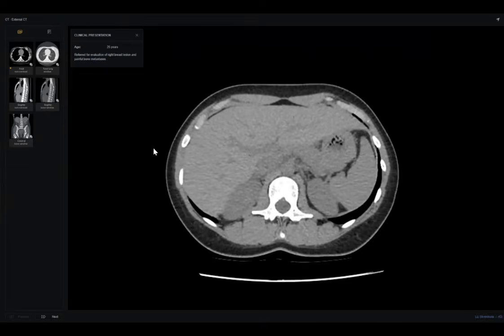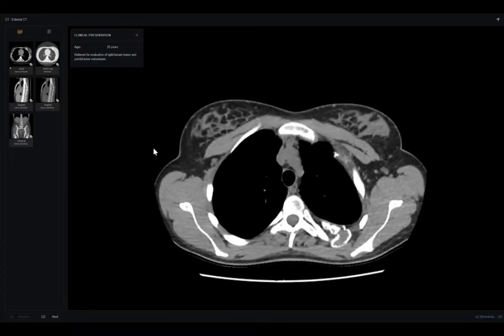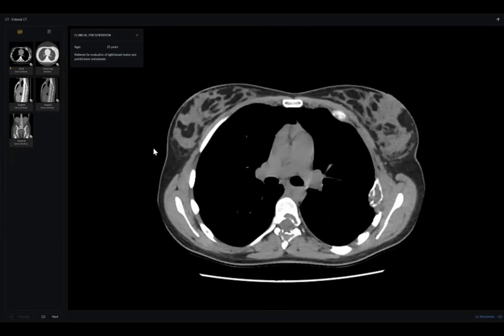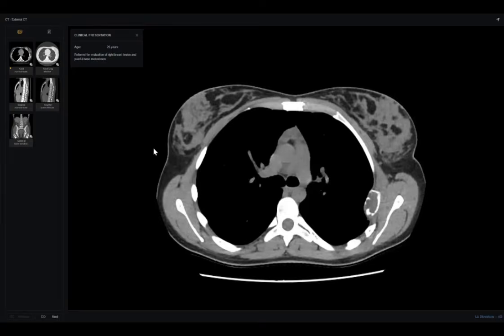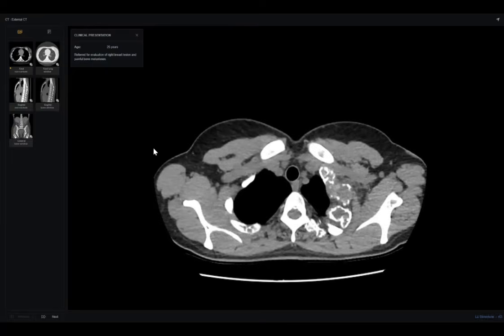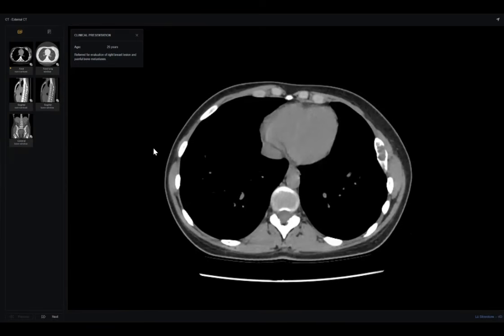Even here, if you look at the breast, there is nothing obvious, but this is the non-contrast. Overall, the breast looks normal, with no pathological lymph nodes in both axillae. Again and again, ask for old or primary examinations like X-ray, ask for MRI to avoid any tricky or confusing cases.